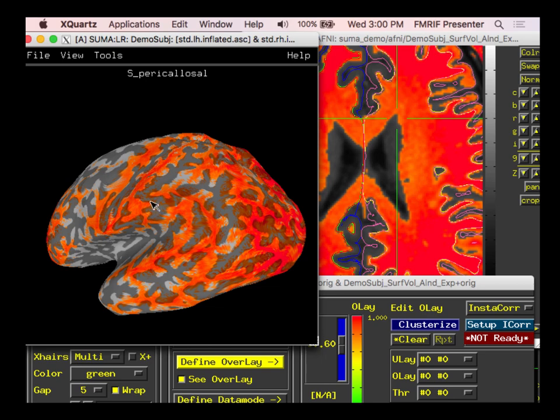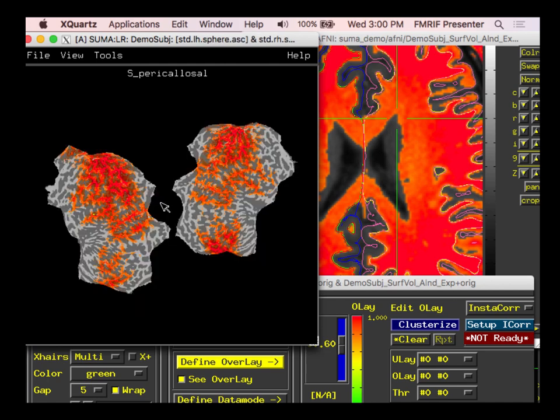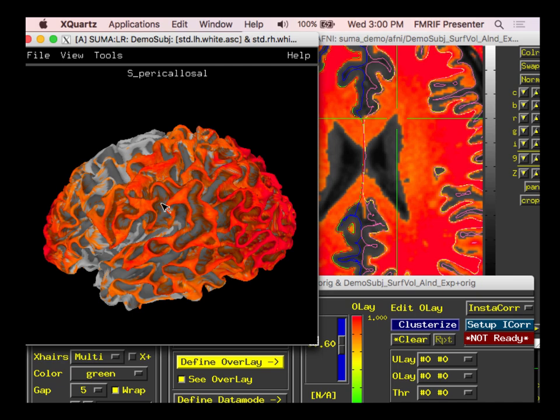How is switching between different views? This aspect, yeah, the period or full stop key. Period, full stop.